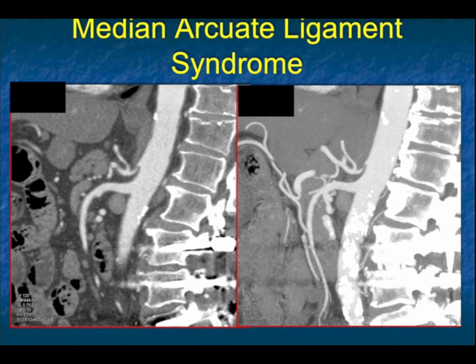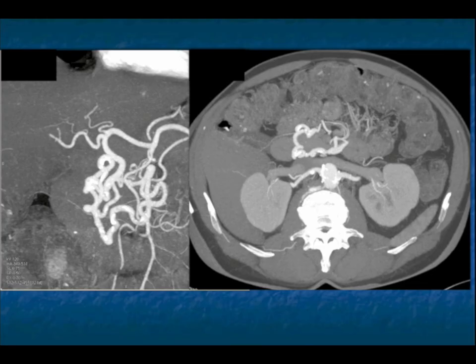If a patient is like this and you have such narrowing of the celiac axis, what you want to do is a bypass graft when you're in there at surgery. If you don't notice it, then the patient can infarct the liver, because you're going to resect the GDA at the time of a Whipple's procedure, and the GDA was the key flow from the patient's SMA to the hepatic artery. Now you lose the flow, so that's very, very important. You can see it nicely there.